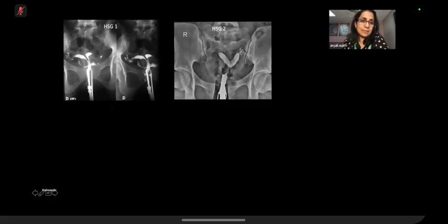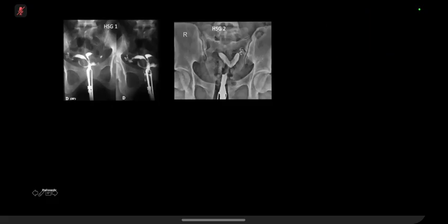So yeah, the two separate hysterosalpingograms. Describe the first one. The first hysterosalpingogram has a single cervical canal and then two separate normal morphology uterine cavities that are completely separate and have normal spill into the fallopian tube. There is an impression of communicating rudimentary horns to the right and left. Although, by the nature of a dynamic study, I would just want to exclude that it wasn't spill that was then collecting in the pouch of Douglas.